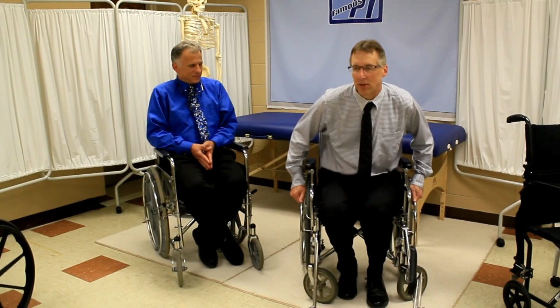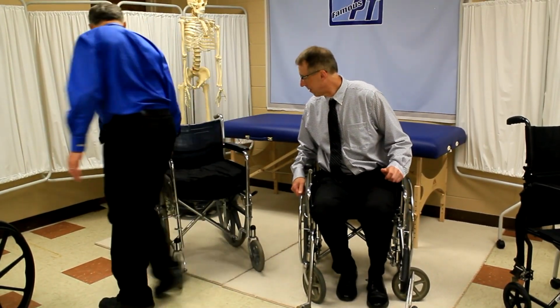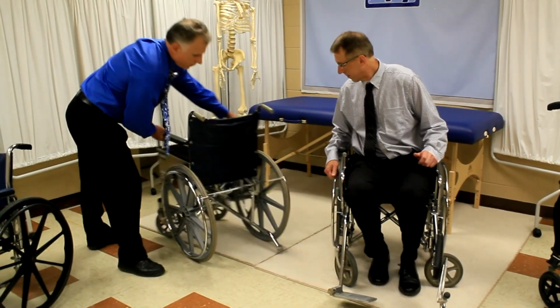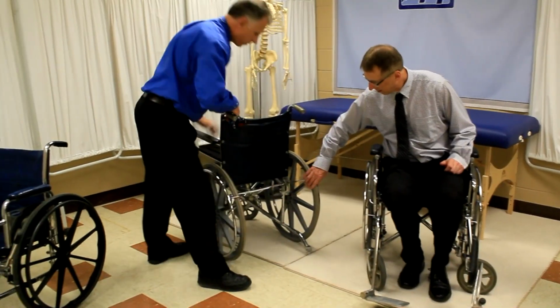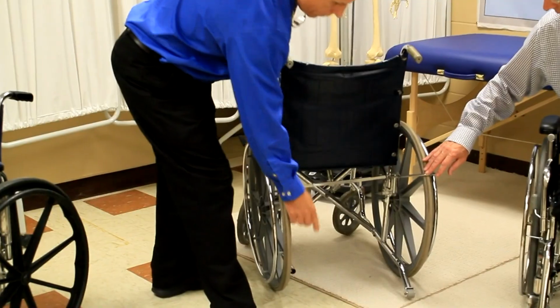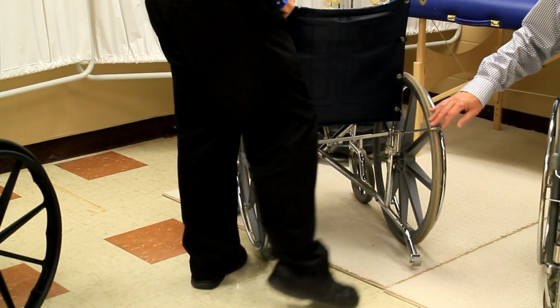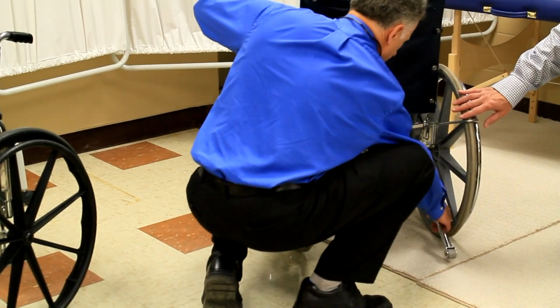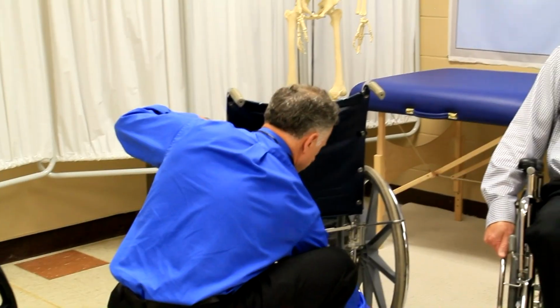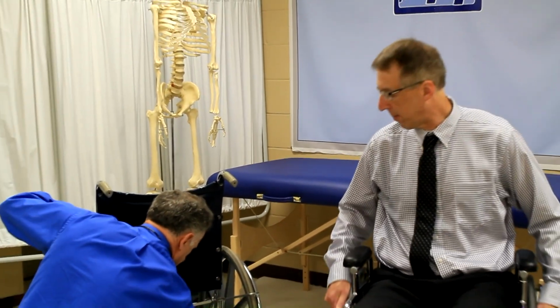So, all right, now we also have the anti-tip bars. Are those on yours, Brad? Yeah, this one has one. We have the anti-tip so that when it goes back, you don't tip over. Now, this should have one on both sides, but it doesn't, but it gives you the idea of what we're looking at. And those usually come off. What's bad about those is if you have to tip your chair back to get up a curb, you won't be able to do it. And a lot of people learn that they have to pop a chair in order to get up on a curb.